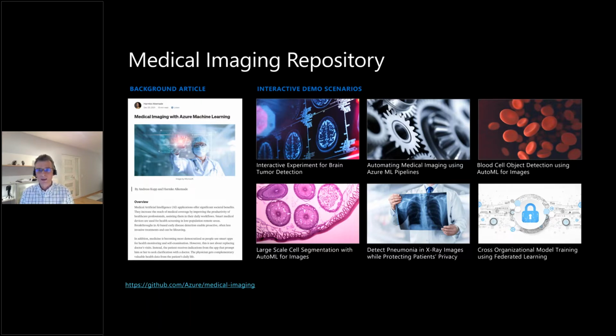But it also covers several different approaches from a machine learning or data science perspective. So we are going to start with an interactive experiment for brain tumor detection, but we also have capabilities included for how I automate the whole process, including retraining. And also, how can I simplify the overall process by leveraging automated machine learning?